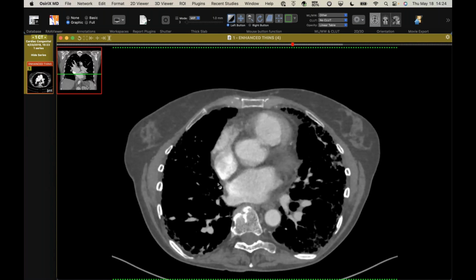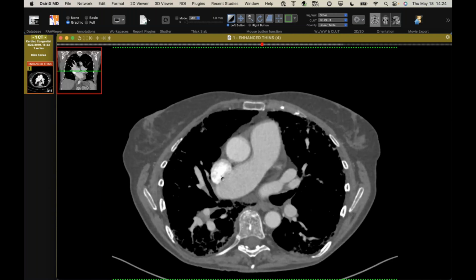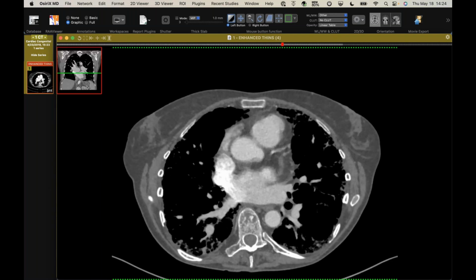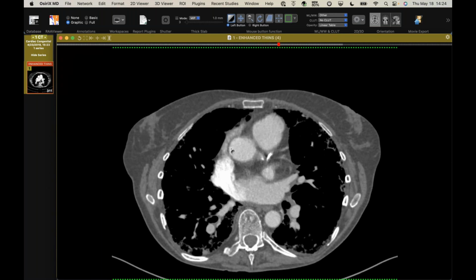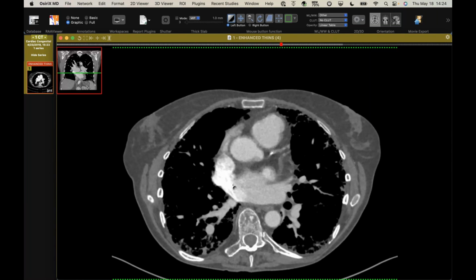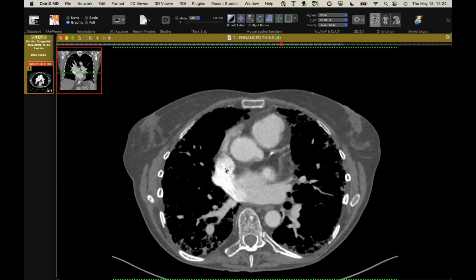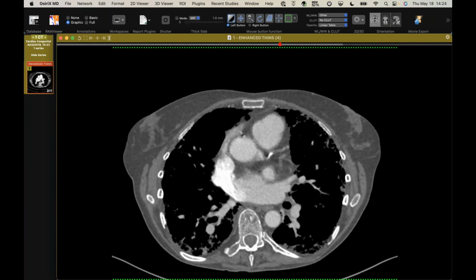If we look for the superior pulmonary vein, it should be coming up there, and it's absent, so it is draining into the SVC. So you've got oxygenated blood coming into this. It should be going into the left atrium, and it can shunt across here, and because the right ventricular and right atrial pressures are normally lower, you'll get preferential blood flow back into the right heart.